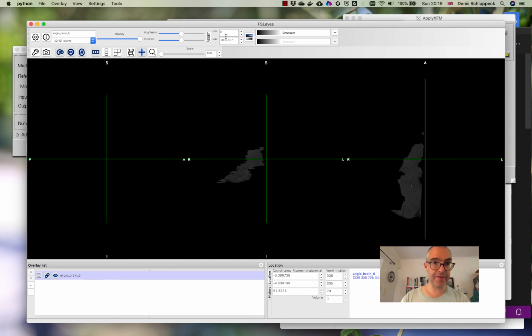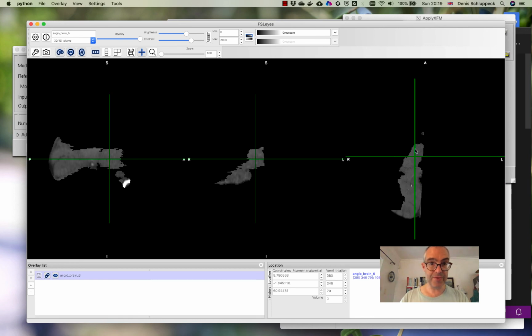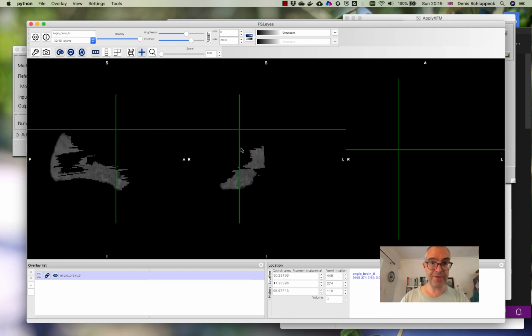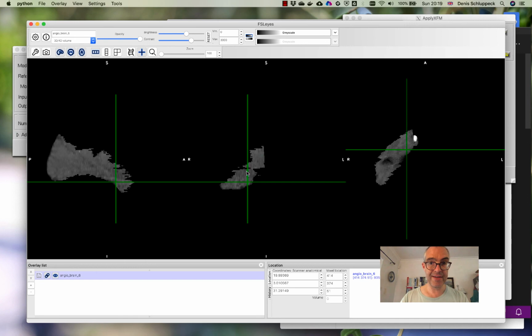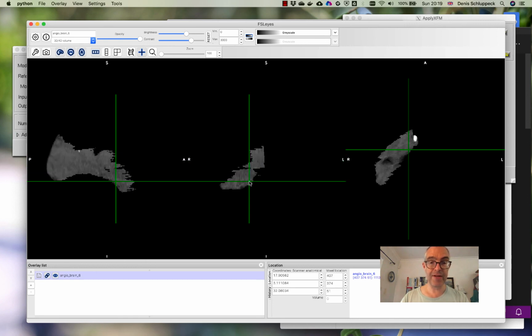Okay, and so if I actually change the values here, maybe make this range a little bit smaller to make them a bit brighter, you should now see we've essentially cut out a part of the original scan, but only in those locations where this is there. Okay, and so this is a way, by now going through this process again, maybe for the value 4, 5, 12, 11, 13, whatever you want, breaking this big image up into smaller pieces.